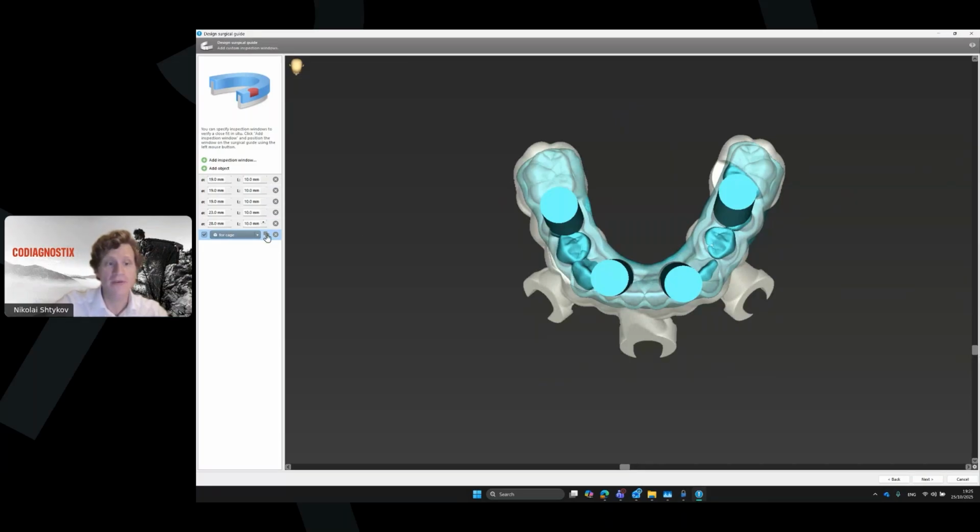And an important thing here: first of all, you click here, not integrate, subtract, offset. You don't need to use any offset. It's also important because you put the offset before, and now you have to use the same STL file. If you put some offset here, you will increase it, and your prosthetic inside will not fit really well. That's why you don't need to use any offset.